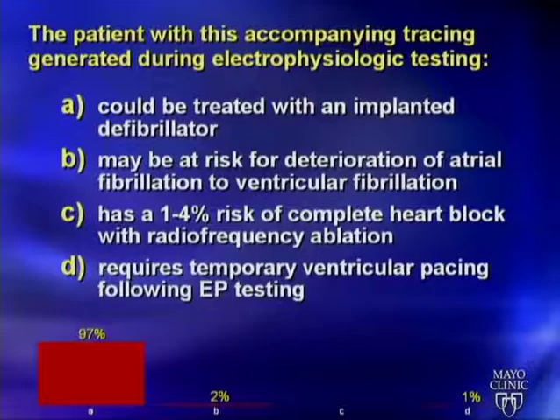Very good. So again, very easy when you have the intracardiacs, more V than A, ventricular tachycardia, you induced it in the EP lab, most reasonable choice there will be a defibrillator. So remember, very few things to remember for the boards. A, His, and V, recognize it and tell the difference between the type of blocks. That's pretty much it. Thank you for your attention.